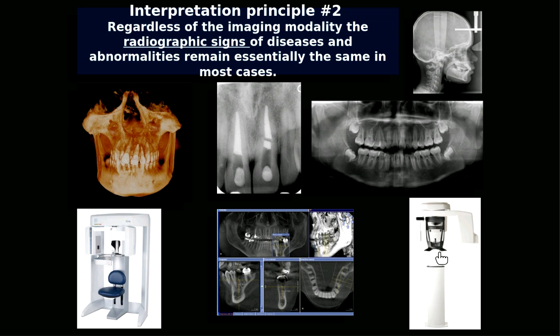And this is a machine we have in our school. It is called the Carestream 8100. This is great for endodontic purposes, seeing 2 to 3 teeth in very high resolution, where you can see a root fracture, or how many canals are there. If somebody has sent you a case and the case is failing, and you find the reason is a missed MB2 canal or a fractured canal, you can really see that. Now, this machine is the iCAT FLX, which you can use for orthodontic or surgery purposes, and for other major purposes.